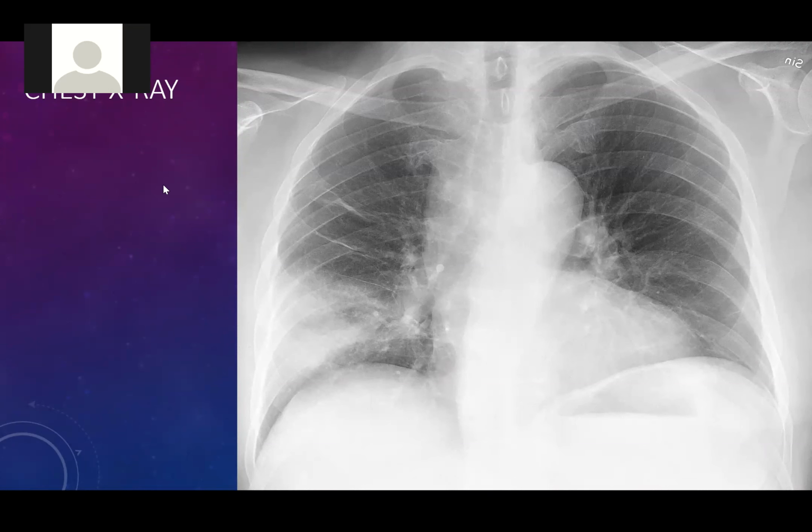I'll start by counting the ribs. You can see 1, 2, 3, 4, 5, 6. 1, 2, 3, 4, 5, 6 in the middle. Yeah. And I can see the anterior ribs, which is good inspiration, right? Yeah. Okay. The vertebrae are also prominent, so that's good dosing. Good. And also in the lungs, I can see the airflow.